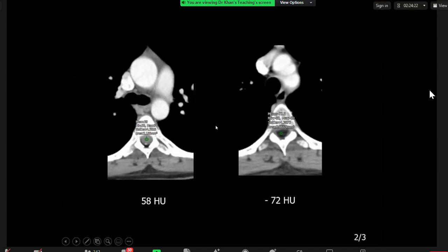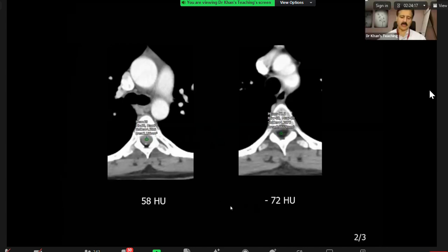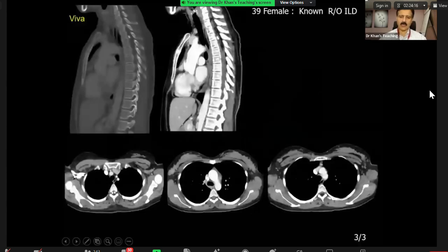Conclusion? A dermoid again. This one is dermoid because there are multiple densities. So the point I am making here is, FRCR exam: unusual presentation of a common finding. Common, if I show you an MR of the spine, you will pick it up.